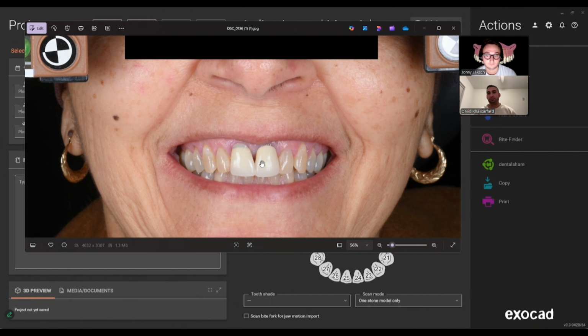It doesn't take much time on our end once the systems are in place, if a patient comes with an aesthetic concern. She came in with just the front two teeth. Sure, could I have addressed the front two teeth? Absolutely. But could we have enhanced the entire smile by doing all 10 teeth on the maxillary arch? 100%. And that's what we did to enhance the smile in totality, because of her smile line, how broad it is, how many teeth she's showing.